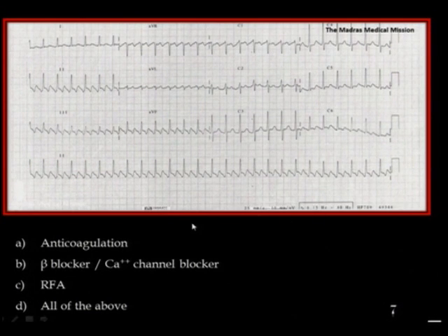One is anticoagulation. Atrial flutter is prognostically as serious as atrial fibrillation. And anticoagulation is recommended if you follow all those risk factors we just now discussed; if this gentleman fits into that category, anticoagulation should be seriously considered. This is a typical atrial flutter. If you cut off the heads of the R waves, you are left with a sawtooth appearance. This is classical sawtooth appearance, which is classical again of a typical counterclockwise flutter, which is very, very effectively cured by radiofrequency ablation.